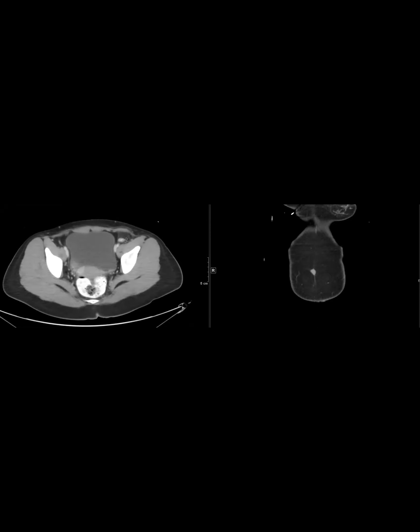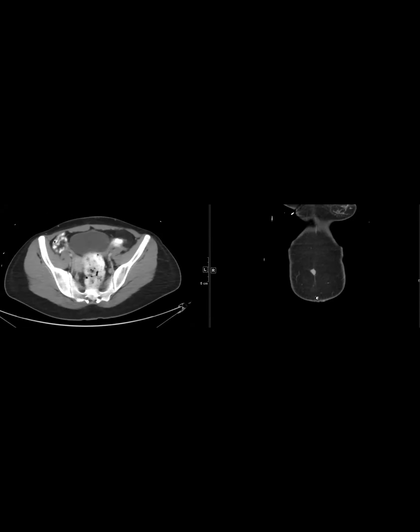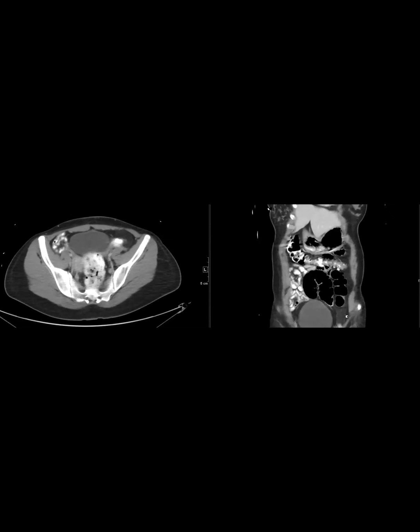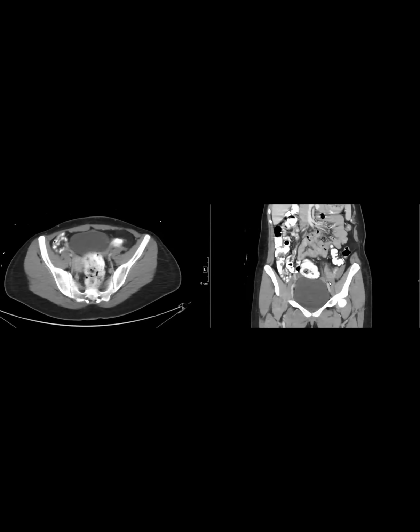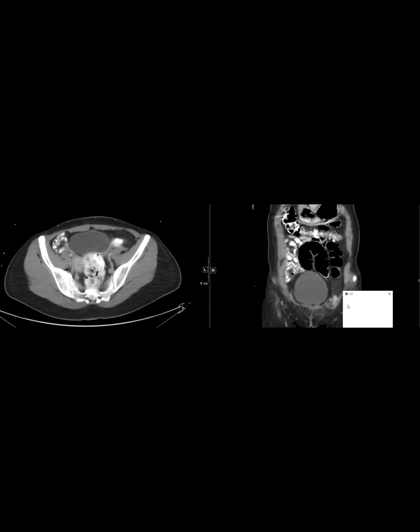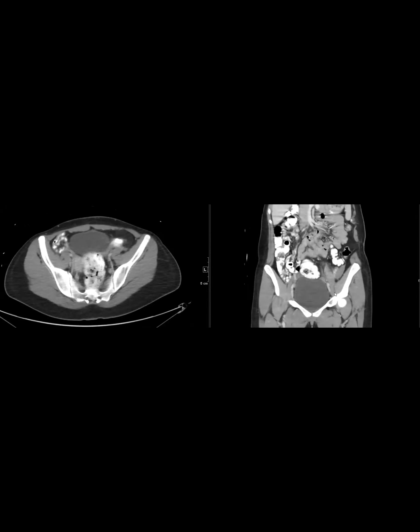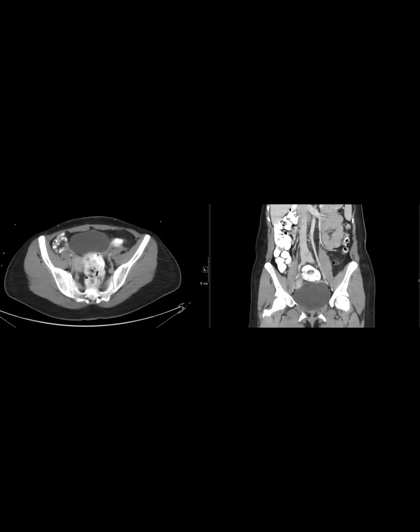Patient has a hernia on the left. Obviously we see hernias a lot, but I've never seen a hernia where you can see this is the ovary, and this is part of the fallopian tube just going into the hernia. Oh yeah. I've never seen a fallopian tube going into a hernia, but here it is. The hernia that ate my adnexa.